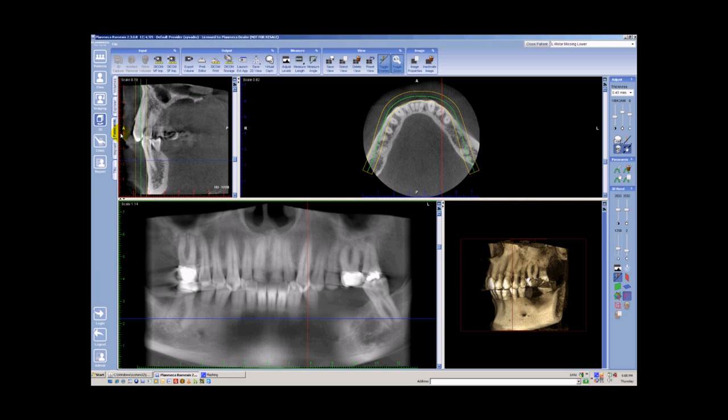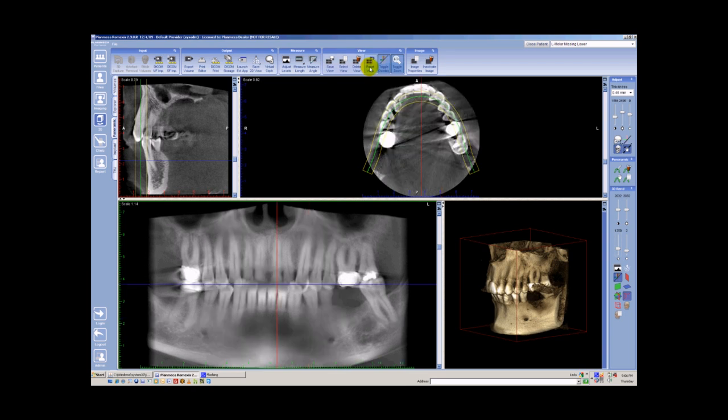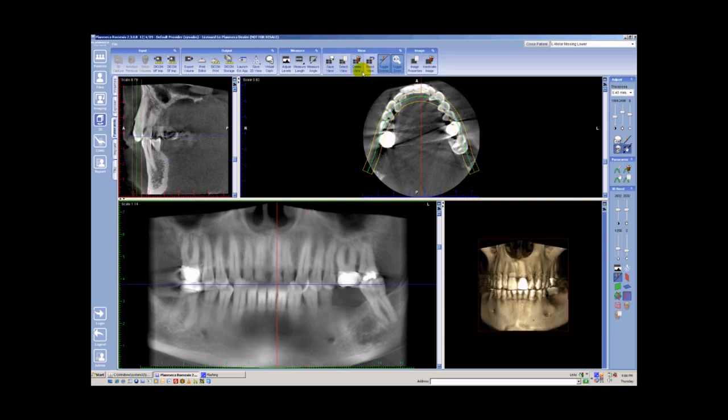Now in the panoramic module, there's a default pseudopan that's created. We do have a sagittal view, default pseudopan, axial view, and a 3D model rendering. You can always hit reset view if the data doesn't come in in an original orientation, depending on if you were working with the data previously or not.